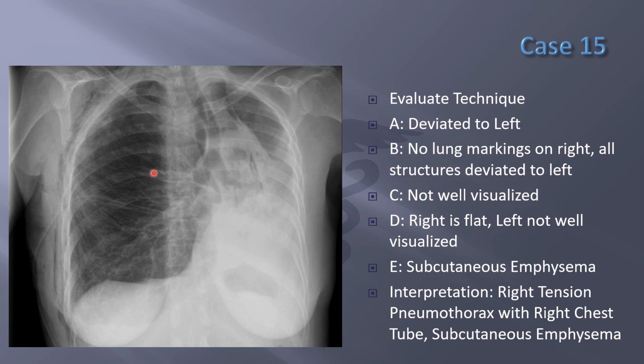This is still a medical emergency if this doesn't correct itself, because this patient's probably in tension right now, meaning the heart is very squeezed, not generating a good cardiac output, not generating a good blood pressure. The patient's probably going unconscious. There's no artificial airway in here yet. And there's no other vascular access going on here. So this is still an emergency.